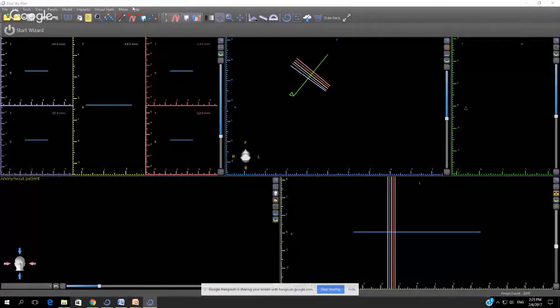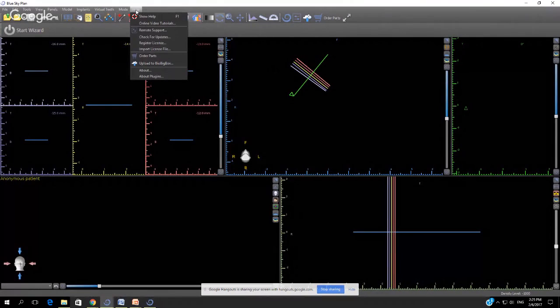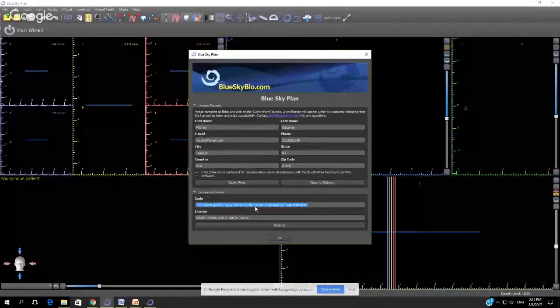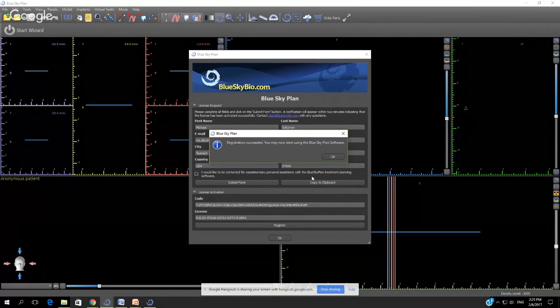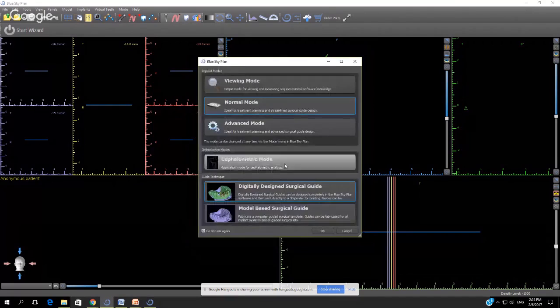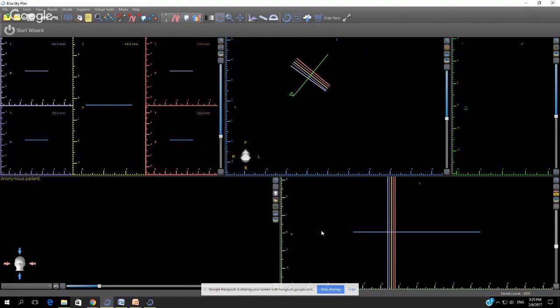While I'm doing this, I'll explain. You could get to the point of designing the surgical guide and doing everything in the surgical guide software without any need to have STL exports. But in order to export the designed surgical guide, that's what we were talking about earlier, which is the fee of between $10 to $20 a case. The reason I say it's between $10 to $20 a case is because we have different packages, and the larger the package, the cheaper the per case is. But the most expensive is going to be around $20, and the cheapest is around $10.